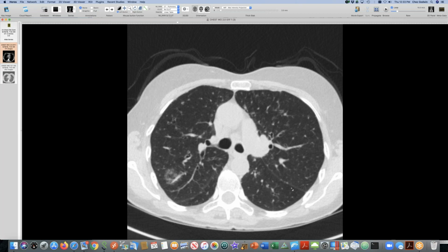Right. Yeah. And David, if you look carefully on that image right there, it's like the fairy ring sign where the reversed halo is, if you look at it closely enough, actually made of tiny nodules. The descriptions of sarcoid as ground glass looks more like tiny nodules than true ground glass nodules like you see with adenocarcinoma. Yeah, good point. So you can actually see that this is a little cloud of very fine nodules. Yeah, that's almost like a reversed halo, sort of fairy ring variant.